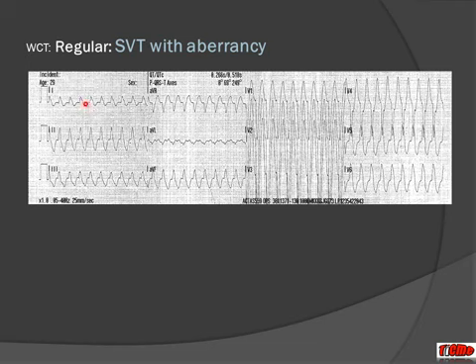We have got terminal R waves in lead 1 and lead V6, and we've got deep S waves, upright T waves in the septal leads. In fact, with this patient, it's going to be important to use your clinical nous to try and work out what it is. This was again a young person. He was a 19-year-old. He was feeling a little bit dizzy, but otherwise all right. He didn't have a diagnosis of structural heart disease and had been usually fit and well. In fact, the ambulance gave this man adenosine, which was, I think, a little bit brave in the context of being in the back of an ambulance, but he reverted to sinus rhythm.